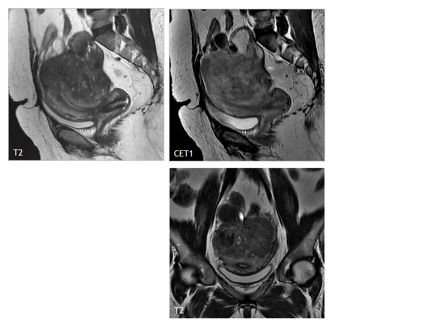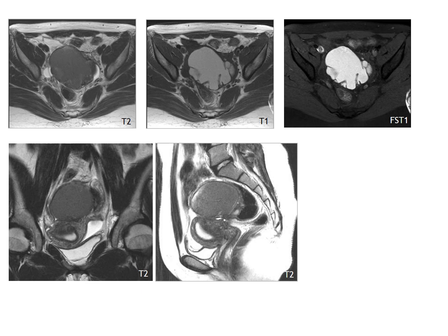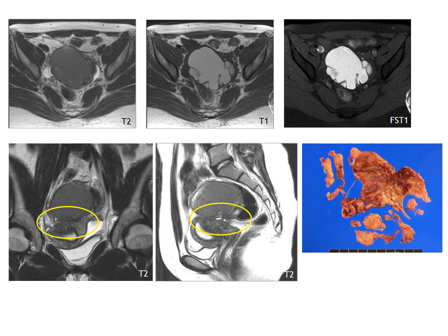Another case of outside-in adenomyosis resulting from endometriosis lesions infiltrating into myometrium. Here is another similar case of endometrioma and adjacent outside-in adenomyosis lesion in the posterior myometrium. Significance of this situation is that it will be impossible to remove this endometrioma cleanly because of severe adhesion between endometrioma and the uterus. This is a specimen photo of this endometrioma, removed fragment by fragment.